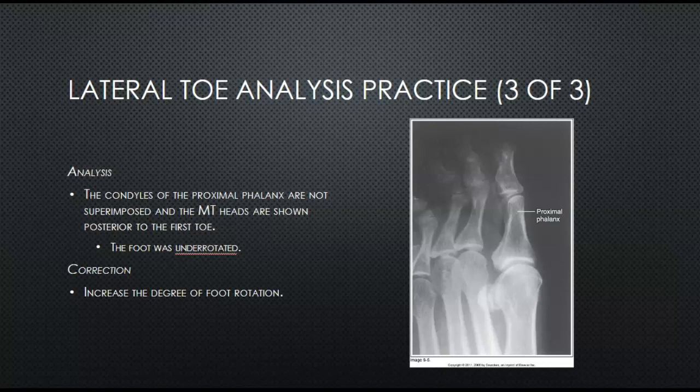In our third image analysis, we can see again our condyles are not superimposed over here, and these toes are demonstrated posterior to the first digit, so we need to increase rotation in order to correct this image.